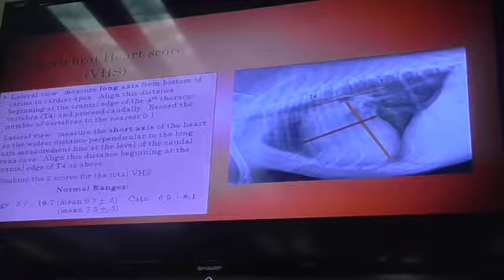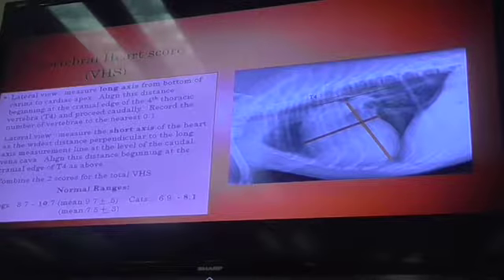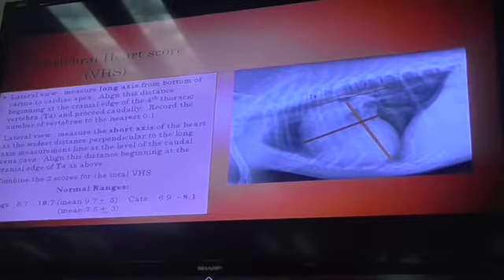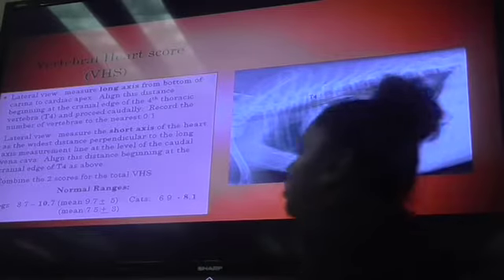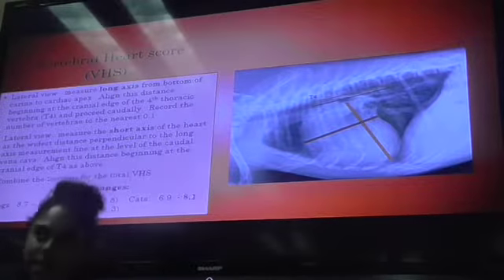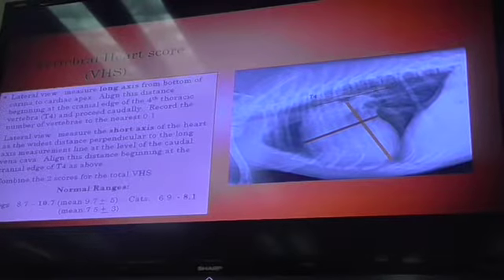Okay? Now we got these 0.1s and such, but it's really just going to be a guesstimation on your part, okay? But you want to get as accurate, so to speak, as possible. But again, all of these are really subjective, and all of these are just really based off of patterns that have been seen over time.